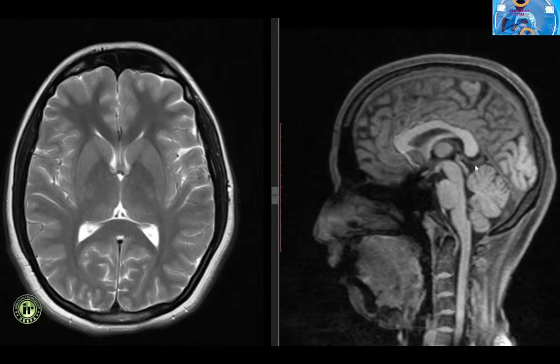The quadrigeminal plate cistern lies along the superior surface of the cerebellum and continues superiorly towards the splenium of the corpus callosum. It is the location of the venous confluence of the vein of Galen with the inferior sagittal and straight sinus and contains the posterior cerebral, posterior choroidal, superior cerebellar arteries and trochlear nerves.